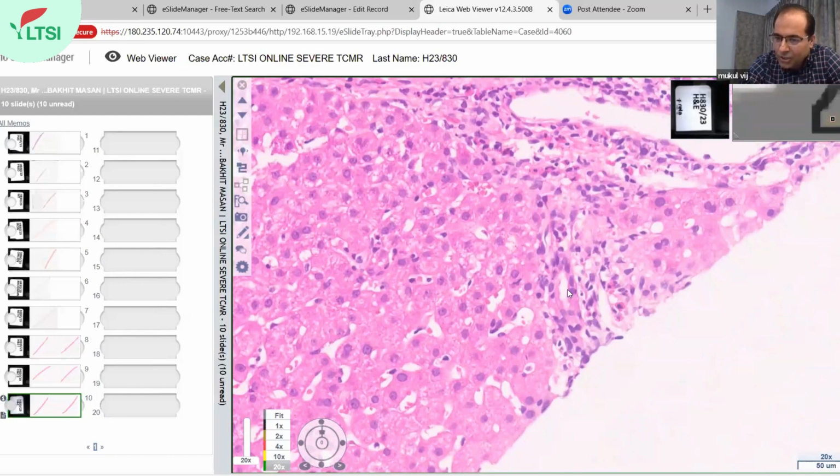There is definitely the lumen, which is elliptical. It's not really rounded, and you can see infiltration by these lymphocytes. See, this is the duct. Can you see the duct? And this is the lymphocyte. So we are seeing inflammation, which is mixed inflammation.